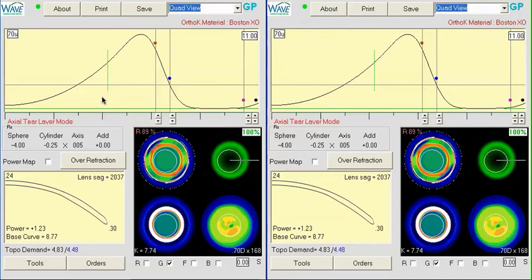in wave. It's hard to make a lens that gives you a very wide treatment zone but still maintains centration. The post-wear maps that you have right now show really good centration of the lens, and there are kind of two strategies we can look at to get a larger treatment zone and hopefully maintain that same centration.